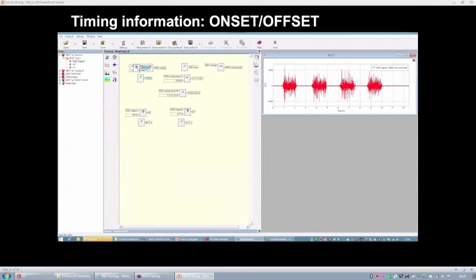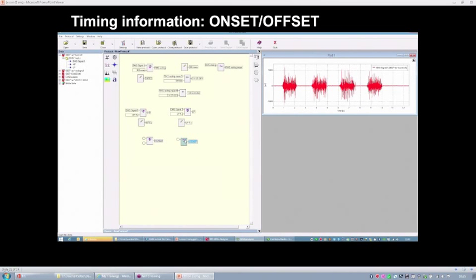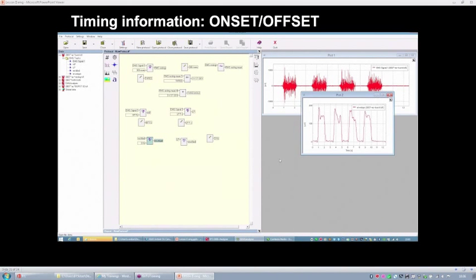And now I'm going to compute the envelope. It is typical, prior to computing the envelope, to perform filtering with a high-pass filter to remove the low frequency noise, and then to remove the high frequency noise with a low-pass filter. Remember that prior to computing the envelope, we have to rectify the track. And now we are going to define the envelope frequency, so 3 Hz, and this is the result.